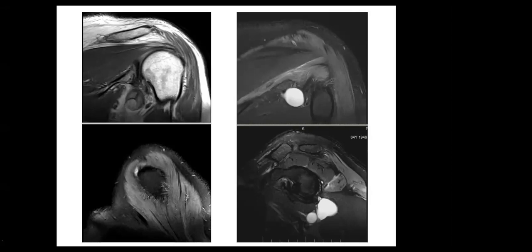What's the name of the condition? This is a lateral triangle space syndrome. Quadrilateral, sorry, quadrilateral space syndrome. At this space, there is entrapment of the axillary nerve. Okay, so the axillary nerve supplies which muscles? Deltoid and teres minor muscle.